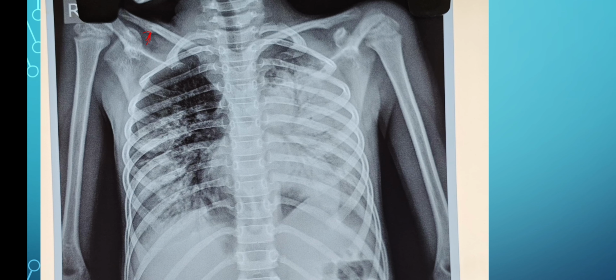On the right side there is a patchy white, heterogeneous opacity throughout the middle. This is upper zone 1, this is zone 2, this is zone 3. So there is a white patchy, heterogeneous opacity in zone 2 and zone 3. The costophrenic angle is not obliterated on the right side, but there is obliteration of the costophrenic angle on the left side. The cardiophrenic angle on the right side is also obliterated, but the cardiophrenic angle on the left side is also not seen well.